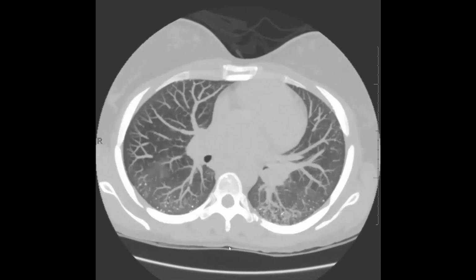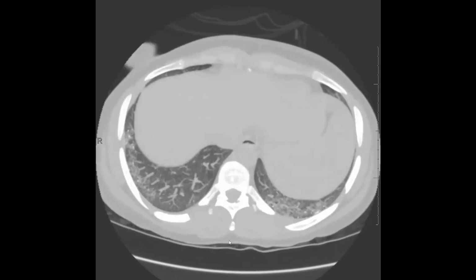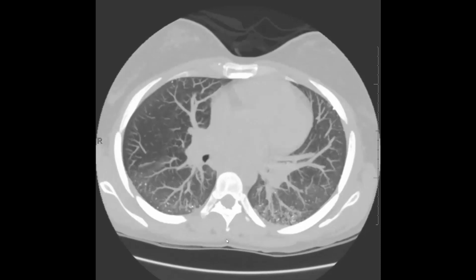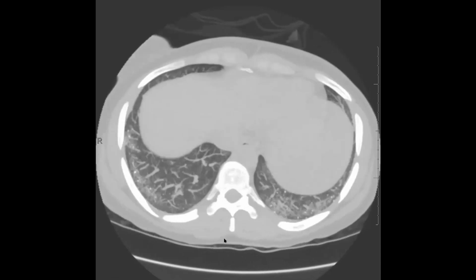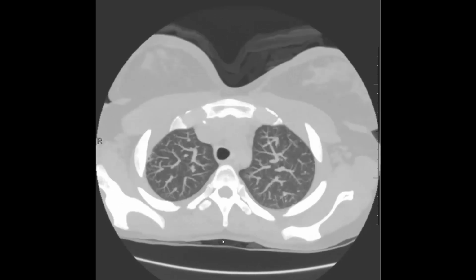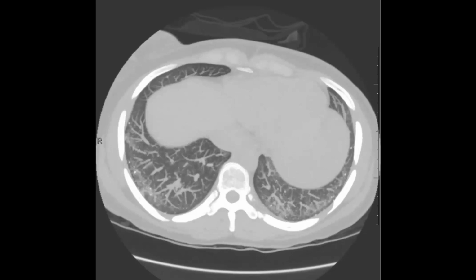There is some anecdotal evidence that suggests that these areas of pulmonary ossification are related to chronic recurrent aspiration. And we know that chronic recurrent aspiration can be seen in patients with idiopathic pulmonary fibrosis, or at least associated with idiopathic pulmonary fibrosis. And some people suspect it in patients with systemic sclerosis as well, given the fact that they very often have esophageal dysmotility, which certainly puts them at risk for microaspiration.